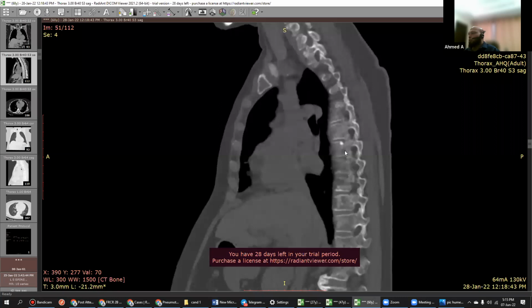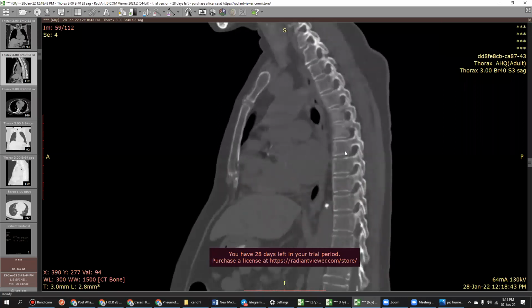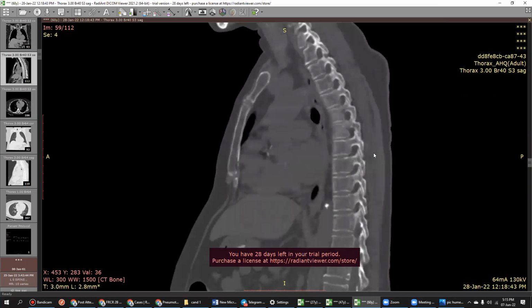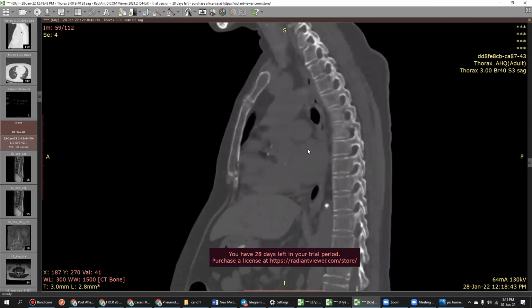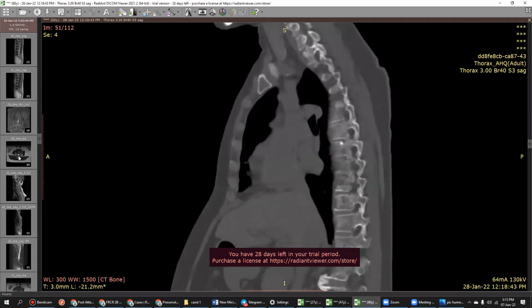Anything else? Nothing. Okay, just a second, I'll help you. Here, can you see anything? The sternum is depressed. Forget about the sternum. Vertebrae, are you finding anything? There are densities here, heterogeneous intensities, maybe a lytic lesion. Okay, fine, no problem. I'll help you. I'll give you this.